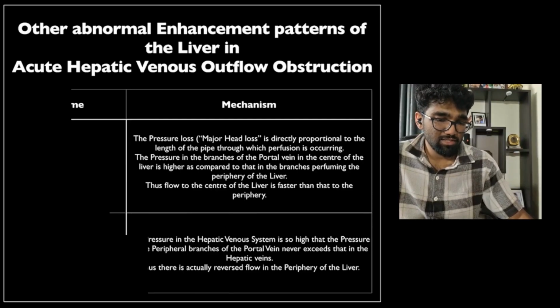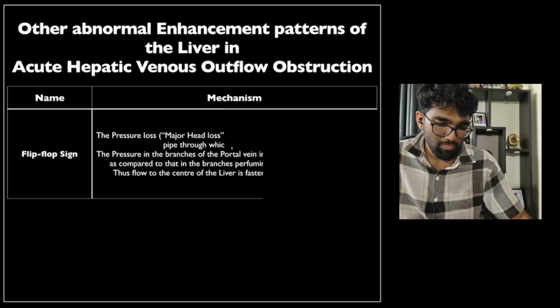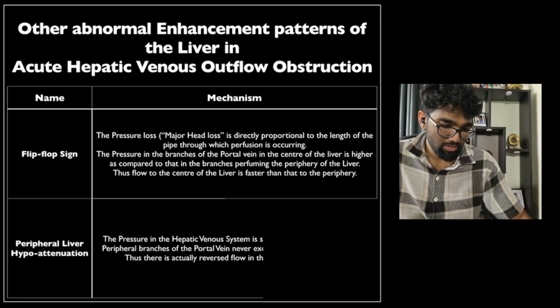Now, there are three other patterns that you might be able to see. Okay, so this is the same thing.